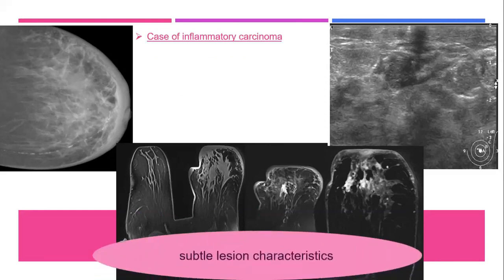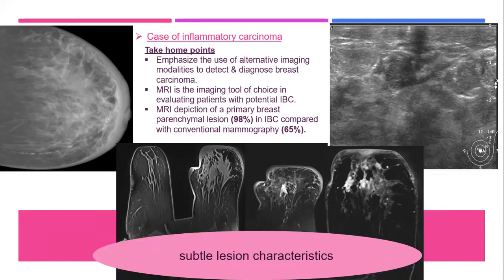So on mammography, we cannot decide if it is a systemic cause, especially if the patient is old. We cannot decide whether the edema is due to cancer or due to systemic cause, or lymphatic obstruction in the axilla or whatever. A lot of differentials, because the only presentation is edema without detectable masses or suspicious calcification.